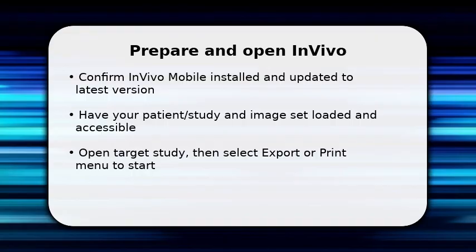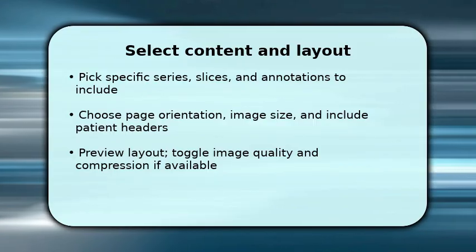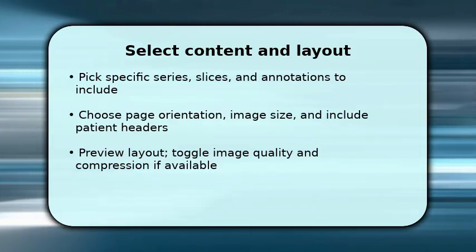Now you refine what goes into the PDF. Pick individual series, slices, and any annotations or measurements you want visible. Make sure to set page orientation and image size, portrait for reports, landscape for wide series, and decide whether to include patient headers and study notes.